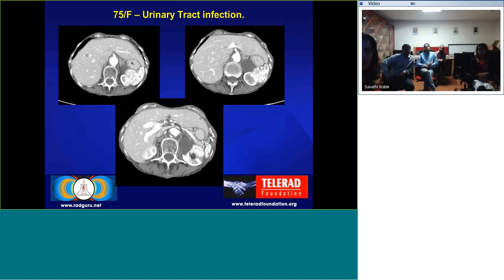Okay. Now, jumping to, I just wanted to incorporate the cases that I saw here. I came across this case yesterday for something totally unrelated. I thought it is interesting, because I have seen these being misread a lot of times, like I said, when we used to see outside cases. What do you think these lesions are? I don't know, it still needs to be confirmed, but from what I've seen, these look like ring enhancing lesions.